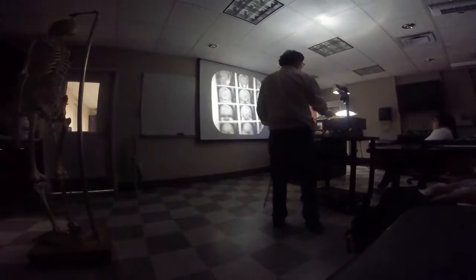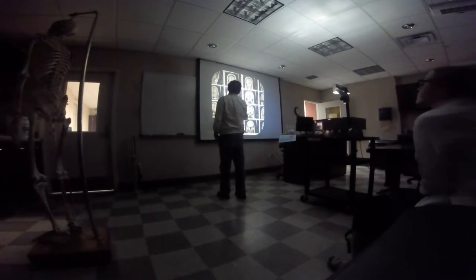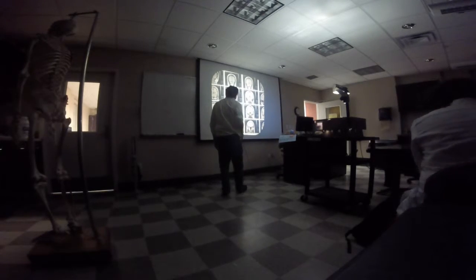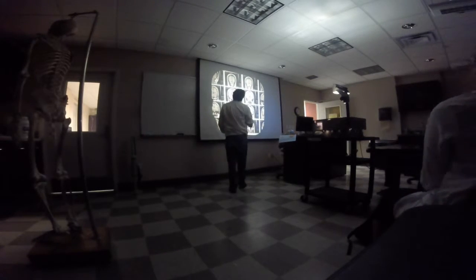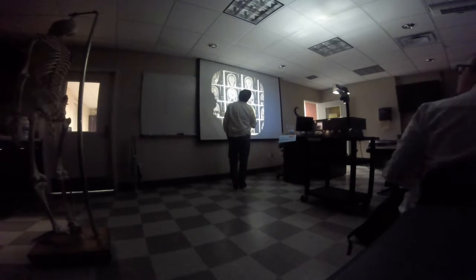Oh, by the way, hold on. From the front, what is this right here? Cerebellum. All right, so what is going to sit right in here? The tentorium cerebelli is going to be right there. Okay. And right here, it's hard to tell, but this is the floor of the fourth ventricle.